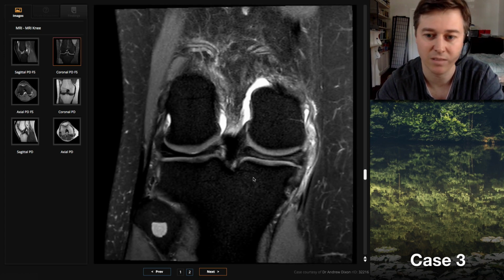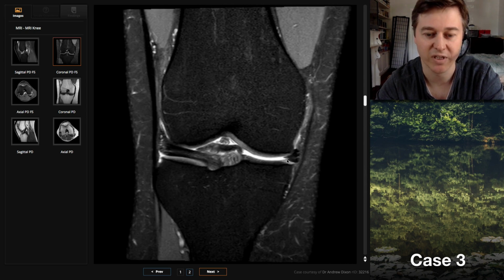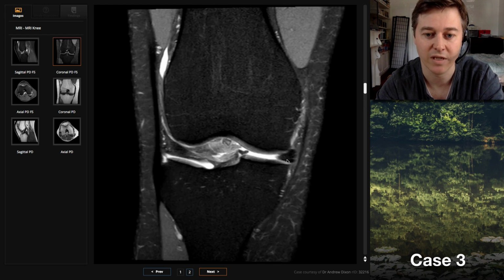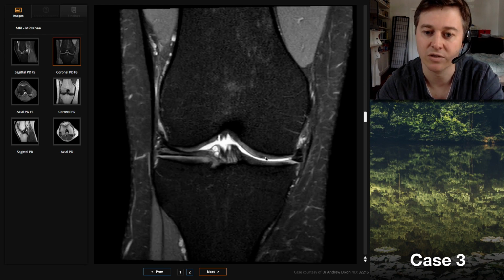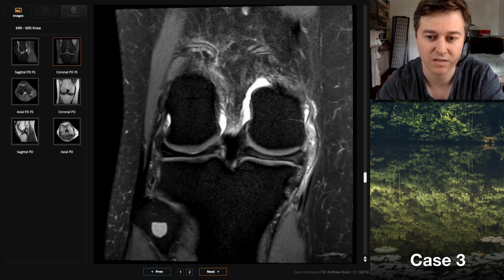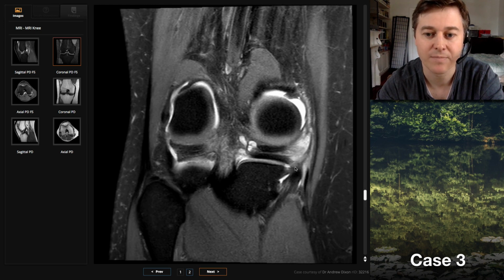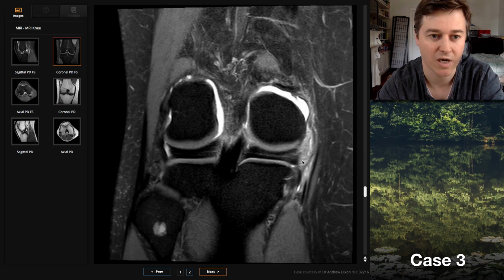And then when you're also seeing that the body of that medial meniscus is truncated as well, you've got to really go and search for that fragment. And there it is, running through that anterior intercondylar recess. It's also worth commenting on the synovitis that's adjacent to this posterior medial aspect of that meniscus, because that often means that it's a symptomatic tear. Because they've got synovitis in that region, so worth mentioning that.